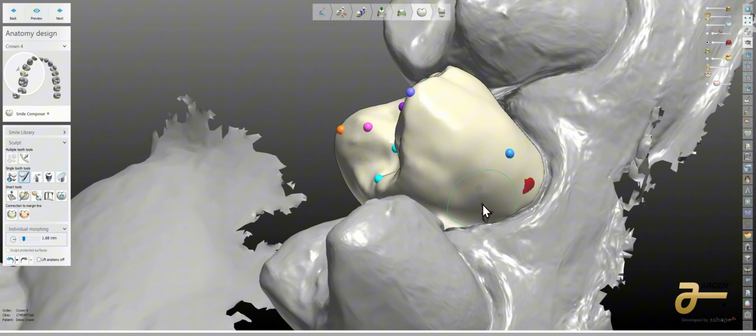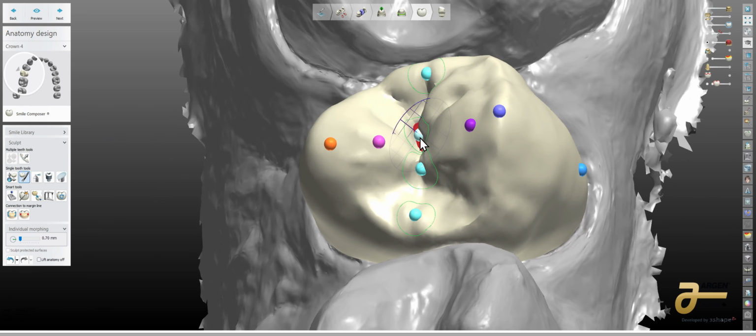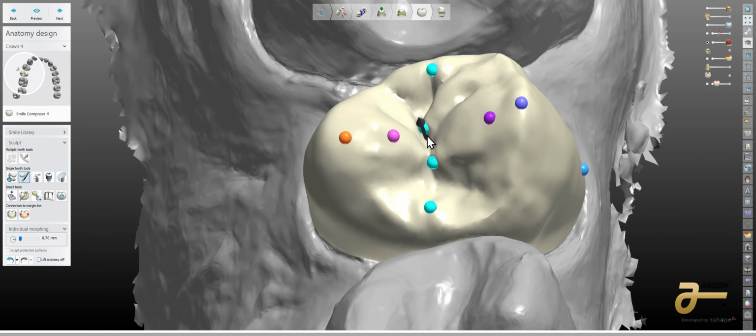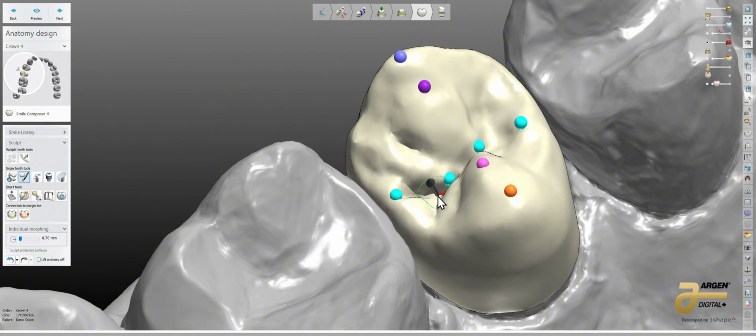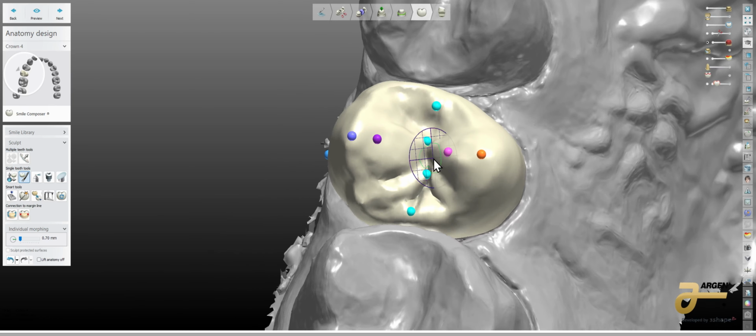And I'm not adding, I'm not destroying the morphology, I'm not smoothing it all out horribly. I'm very selectively moving where I need to get thickness. Now we have to really understand that we're doing a reductive technology on this. Well, reductive technology, there's going to be some limitations, right? Your drill comp is going to have a hard time getting into some of these areas.